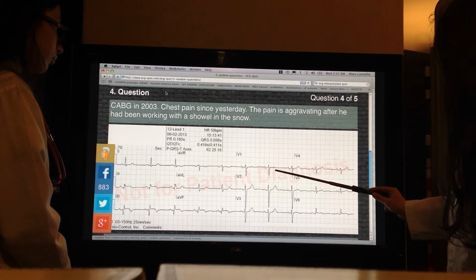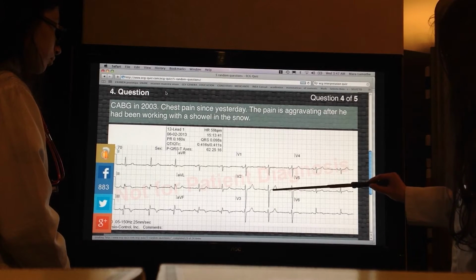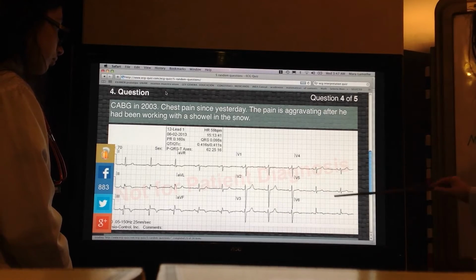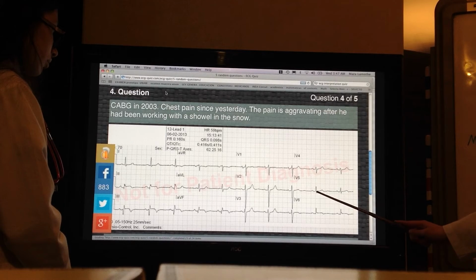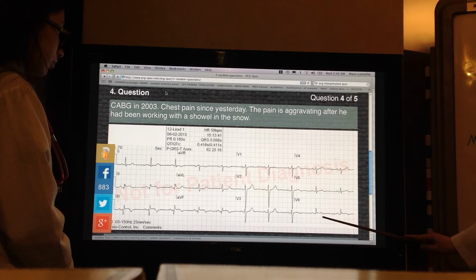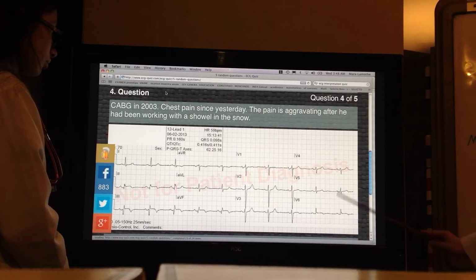Here the T wave is positive and the QRS is negative, and in this also, but in these limb leads it is permitted. And here the T wave is positive and the QRS is positive, and here the T wave is positive and the QRS is positive. The T wave is negative and the QRS is positive, so here is discordance.